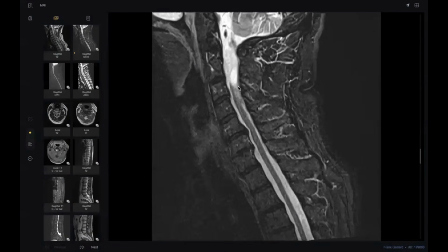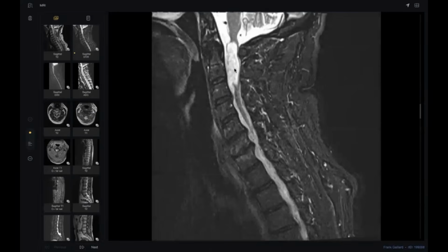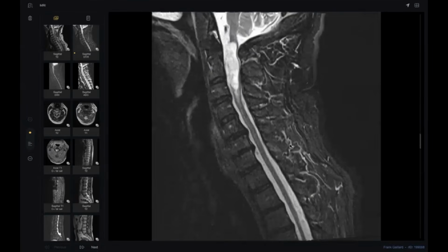If infarction, search for a cause like dissection, vasculitis. But in an easy case like this, or an obvious tumor like this, search for metastasis. Your doubt must be directed towards the complication, metastasis here. You talk about the vertebrae, but this is not the most common site of metastasis here. Ependymoma or pilocytic astrocytoma may metastasize trans-CSF, drop metastasis.